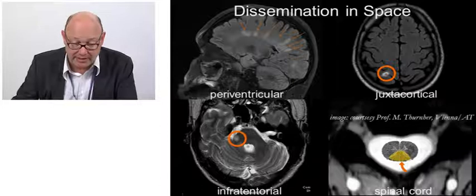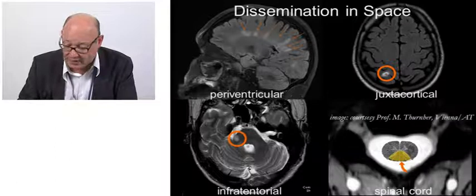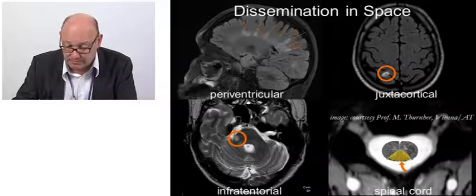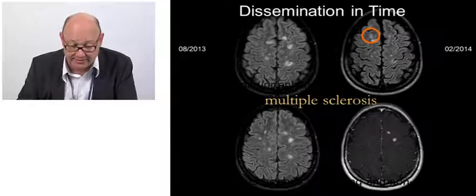This is the same patient, other slices, where you see that some of the lesions are enhancing. Actually, this is the lesion that was explaining the clinical symptomatology of the patient. So we see enhancing lesions and non-enhancing lesions. This is a follow-up study where you see that some of the lesions have disappeared and that there is a new lesion over there. So if we see this phenomenon, this is dissemination in time, and I'm quite sure that you already made the diagnosis now of multiple sclerosis.